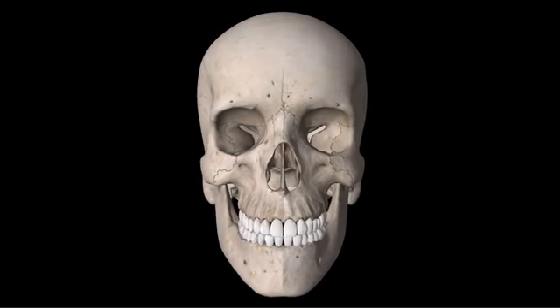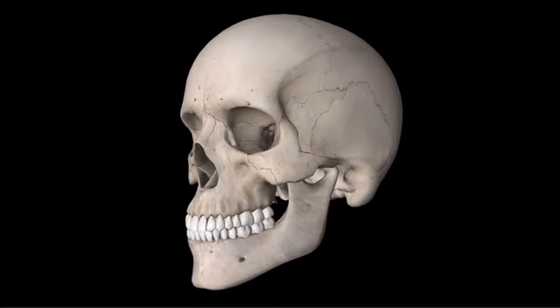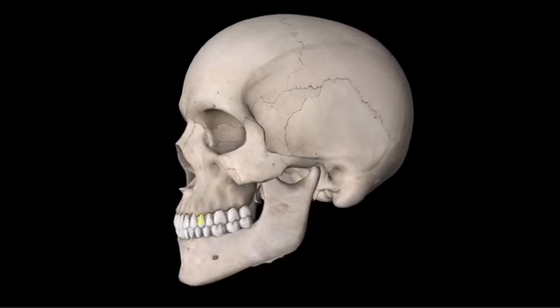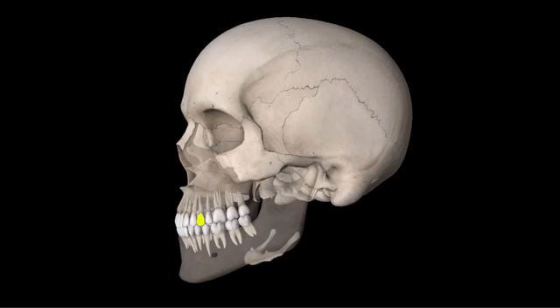So for us to understand the SLOB concept further, let's assume the upper left 4 is post-crowned. Externally, we can only see the crown, and here it is. The maxilla and the mandible are faded to visualize the roots. Pay more attention to the upper left 4. The root appears to be one because the buccal and the palatal canals are superimposed on each other from this view. Okay, so for us to determine the position of the post, we need to have two images, remember.